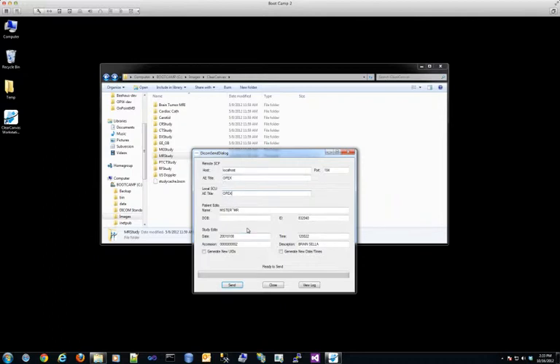Down here are patient and study level edits. Another common need is if you have an existing DICOM study on disk, you want to edit some of these key attributes on the fly during the send. That may be needed because the archive may use those for various identification purposes. So you can modify the name, date of birth, the patient ID, study date, study time, accession number, the study description, and you can even generate new UIDs and generate new date times.